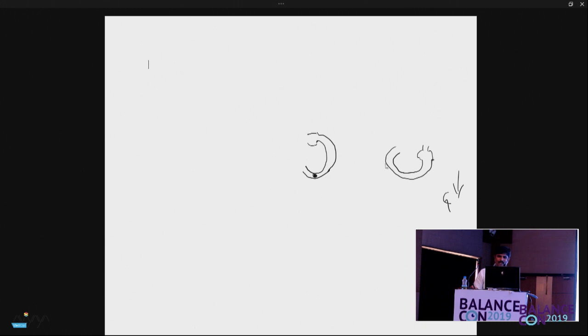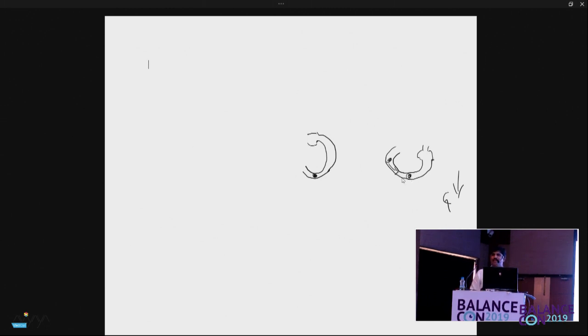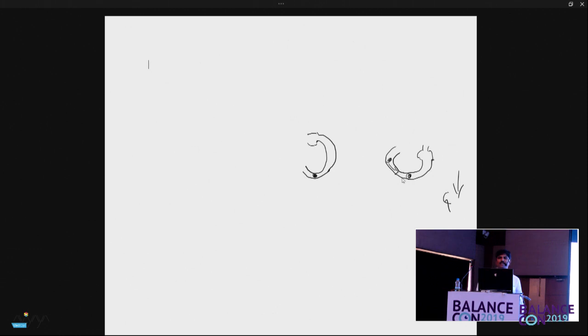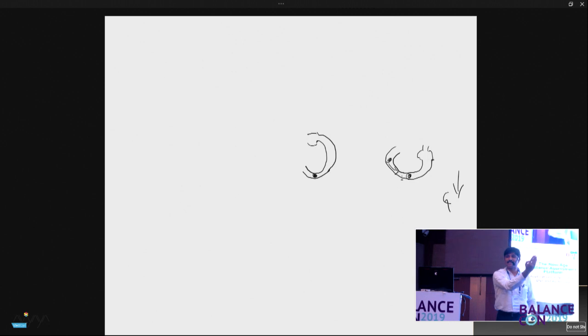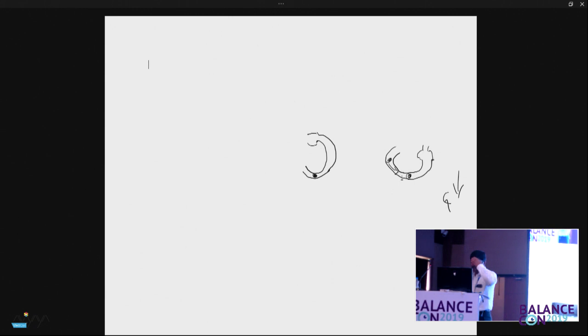Now, the debris was here, in the right horizontal canal. Now the debris gravitates to the dependent position. So where does it go? In this direction. Is that right? And it reaches this pit. Yes or no? Yes. So what is supposed to happen? Inner ear fluid is moving in this direction. Correct? Which means my eye will move slow in that direction. Expected nystagmus direction is right beating. Just see if there is a right beating nystagmus in that particular graph.